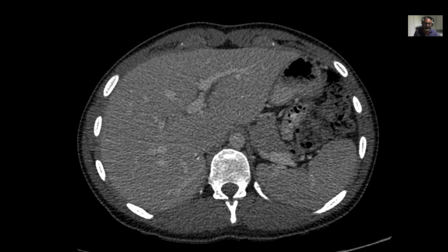But there are going to be a lot of structures here. We'll go through them, and if it's a little round structure that comes into view but then vanishes, it's a lymph node. And as long as it's lesser than 1 centimeter, it is not something that you need to worry about. And always clinically correlate. Do they have other lesions like in the liver or the spleen, etc. So they're para-aortic lymph nodes. These are all retroperitoneal, not pre-aortic. Remember, para-aortic. They're on the side of the aorta.